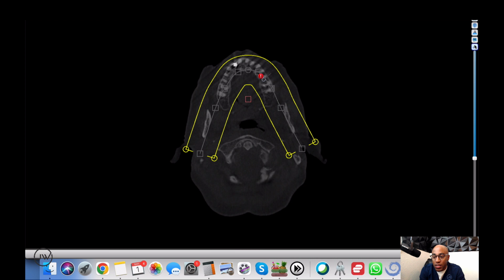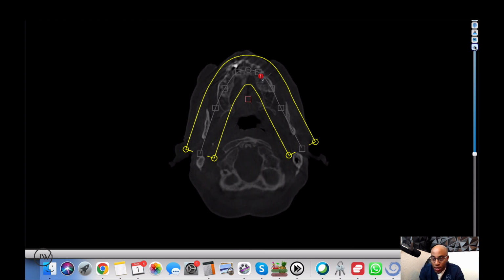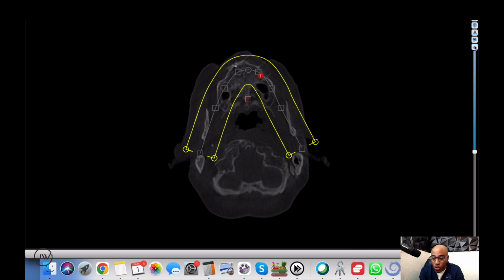So what I'm gonna do is this: you're gonna see this blue outline is the actual implant. So here's the buccal and the palatal bone, and we just want to make sure that we're 2 millimeters buccal, lingual, mesial, distal, so we're not close to any teeth. And so what we're doing is working our way towards occlusal, and then the implant's gone. So as you can see, here's the maxillary sinus starting to approach at that area.